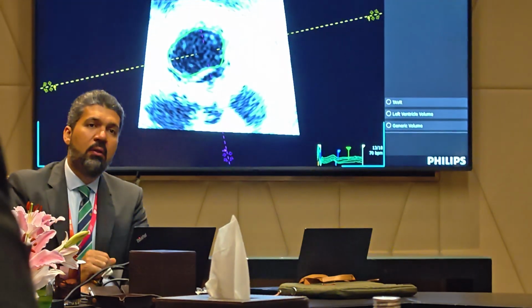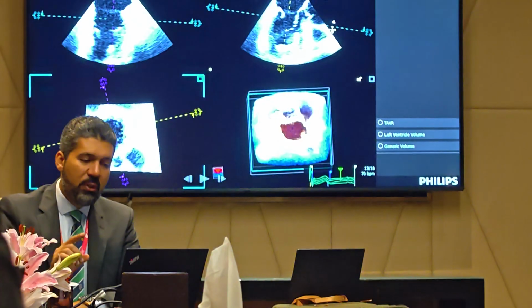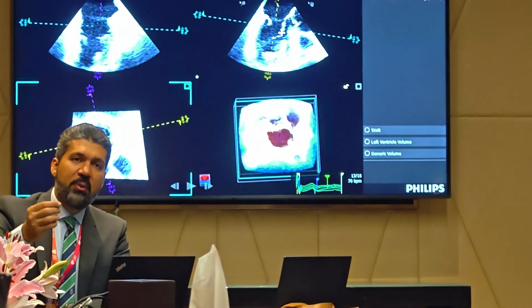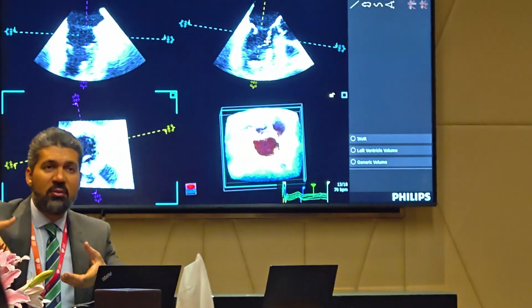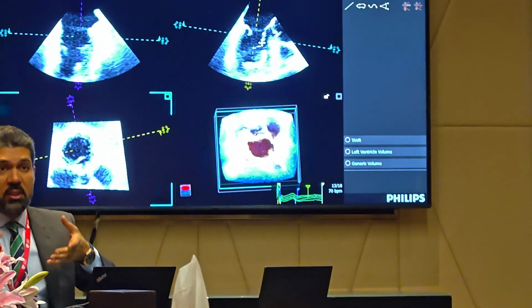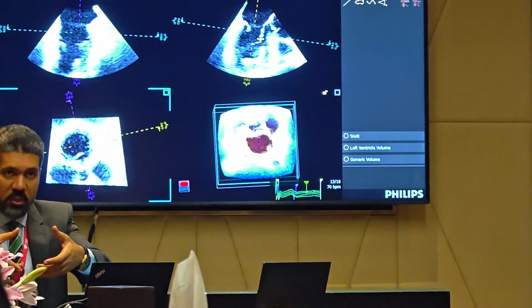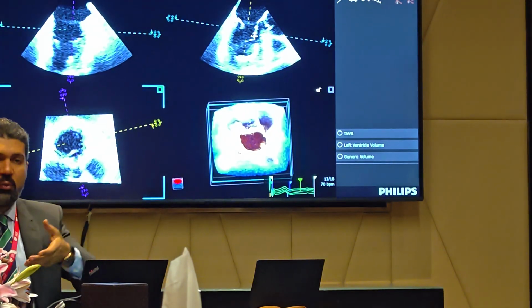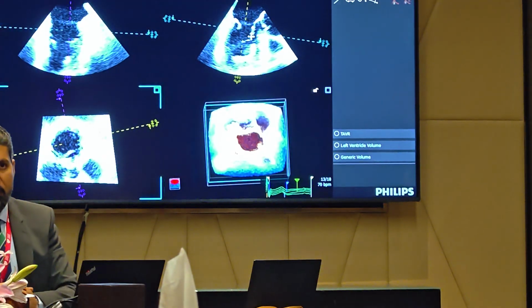In this image also, if you see, one leaflet is going down, and the other one. Remember, this is the subvalvular apparatus here. But remember that in cases where there is no stenosis, the subvalvular apparatus is just cords. It doesn't cause a real funnel shaped orifice of the mitral valve. But in mitral stenosis, yes, it goes down. In that case, you go down as long as you see a full circle, just go for the full circle. If it is a complete circle, you go for it. Otherwise, if it is like a band from here, but there is nothing here, this is not an orifice. Okay?